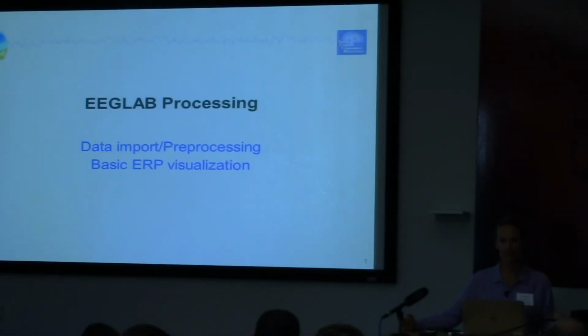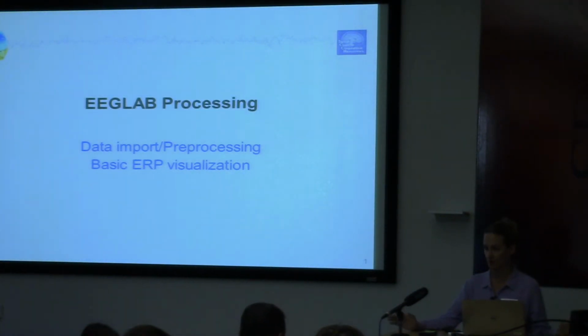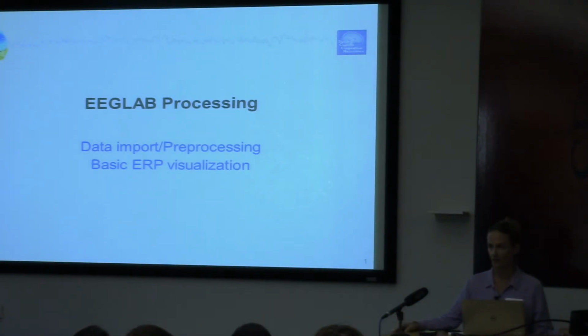EEGLAB track. So we're going to go over the very basics: opening EEGLAB, importing data and pre-processing, talk a little bit about running ICA, looking at your components, that sort of thing.